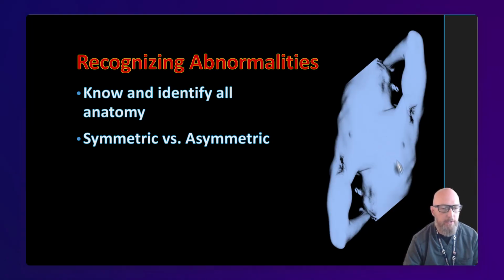This may look kind of funny to us. We're used to bodies being symmetrical. For example, when you look at a panoramic radiograph, you should expect to see relative symmetry. A full mouth series of intraorals also looks the same from one side to the other, and it should be fairly symmetric. Patients are pretty symmetric most of the time, so it's surprising how often this works.